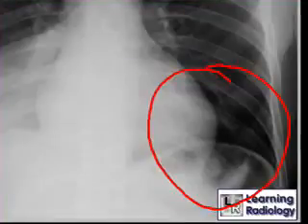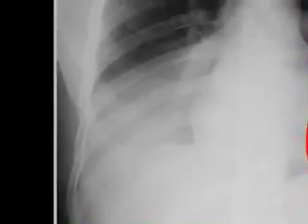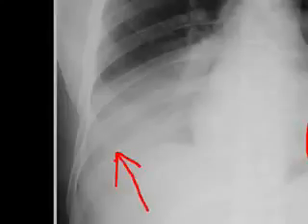Here in the left lower lobe, which is normal, we can see the left hemidiaphragm because there is air both on top of it and in this case in the colon beneath it. If we look at the right side, we no longer can see the hemidiaphragm. The hemidiaphragm is invisible, rendered so by something in the right lower lobe, which is now the same density as the hemidiaphragm and the liver below it.